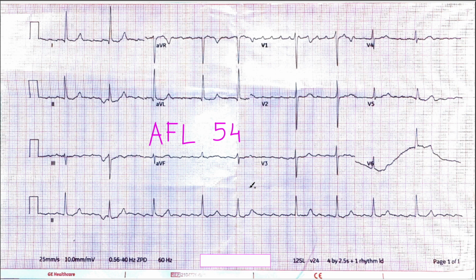Okay, the low heart rate and high heart rate when it comes to atrial flutter is a bit of a concern. So check out the deep dive video.